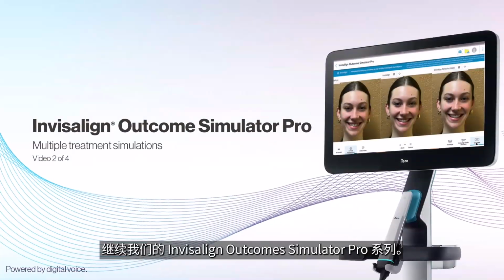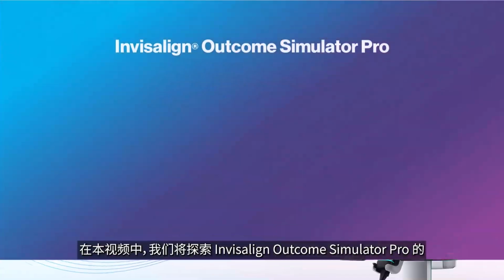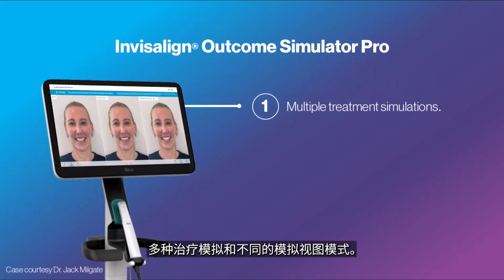Welcome to the second video in our Invisalign Outcome Simulator Pro series. In this video, we'll explore the Invisalign Outcome Simulator Pro, multiple treatment simulations, and the different simulation view modes.